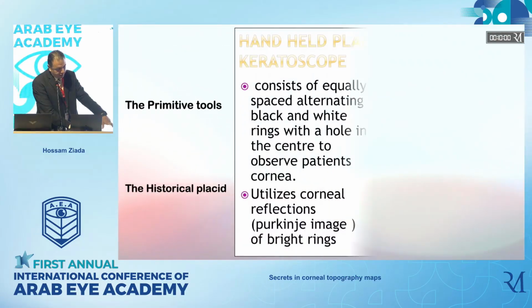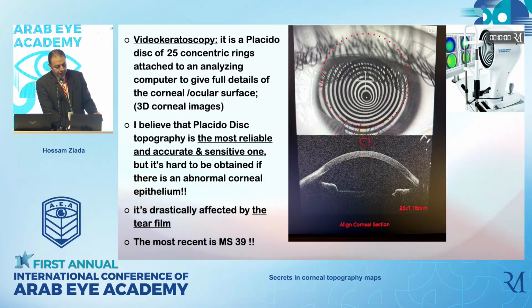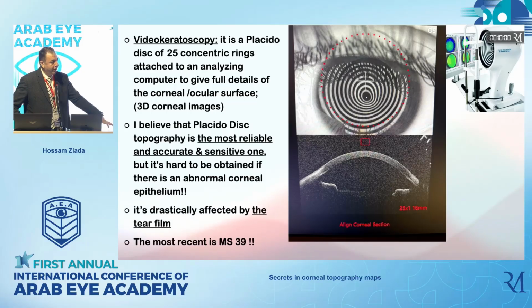And for the sake of time, we will skip all of these slides. But nowadays we have a new era regarding the OCT-based tomography with the Placido disc, which is combined in the MS-39, and actually MS-39 has been in use since 2022.